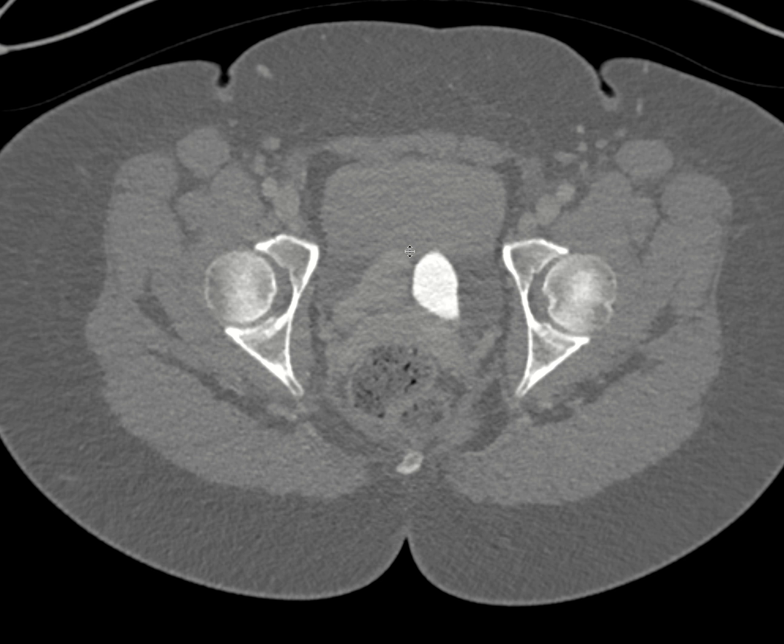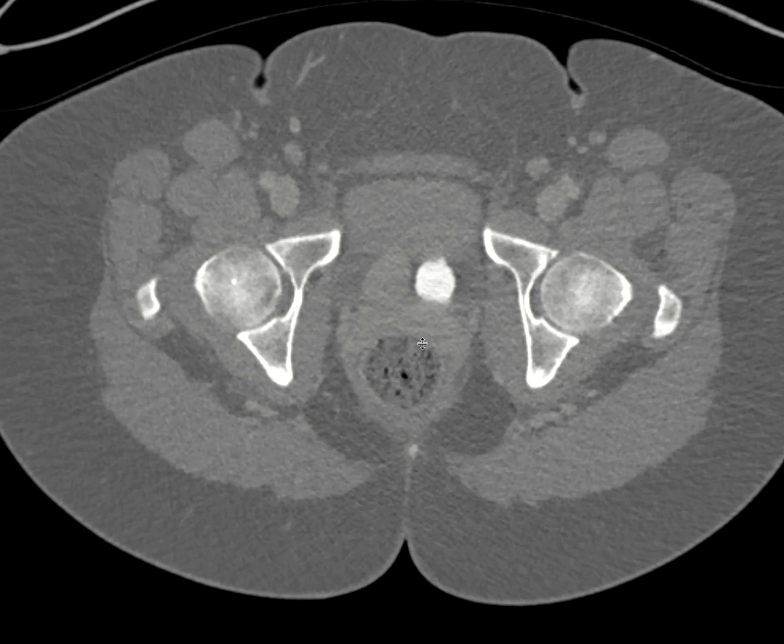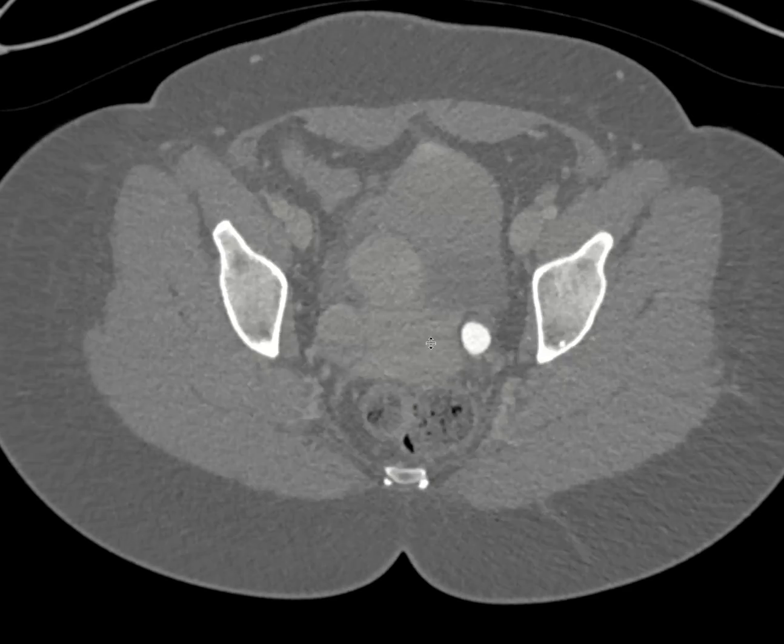Ureteroceles are cystic dilatations of the distal ureter as it enters into the bladder. Sometimes this is referred to as the cobra head sign because it looks like cobra heads pouching into the bladder. These are more common in females and in pediatric patient populations and can cause urinary tract obstruction or infections. Sometimes these have to be surgically managed.